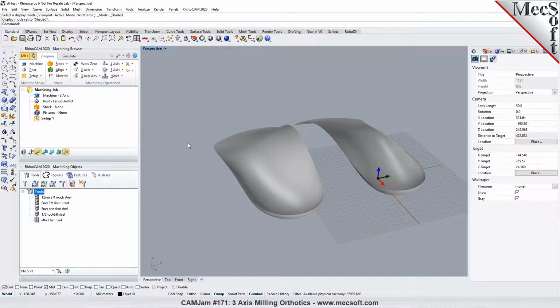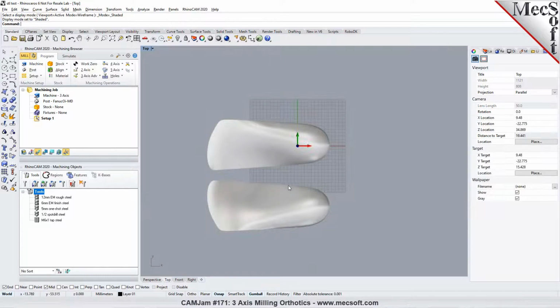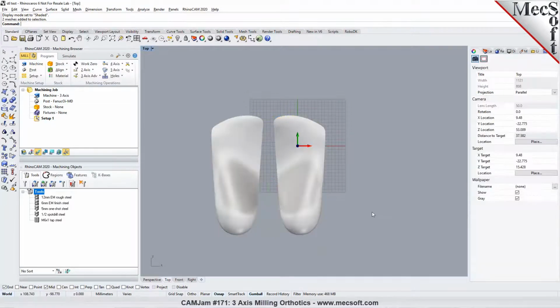So the typical workflow here is once you open the part, you want to make sure it's in the correct orientation for machining. So we want to make sure that your mill or router has enough travel on the x-axis to fit this part to be able to machine it. If you need to reorient the part, you have tools to rotate it. So I can select this and say I want to rotate this by 90 degrees or the other way around, so I can rotate the part. Okay. So to fit it on the machine tool.